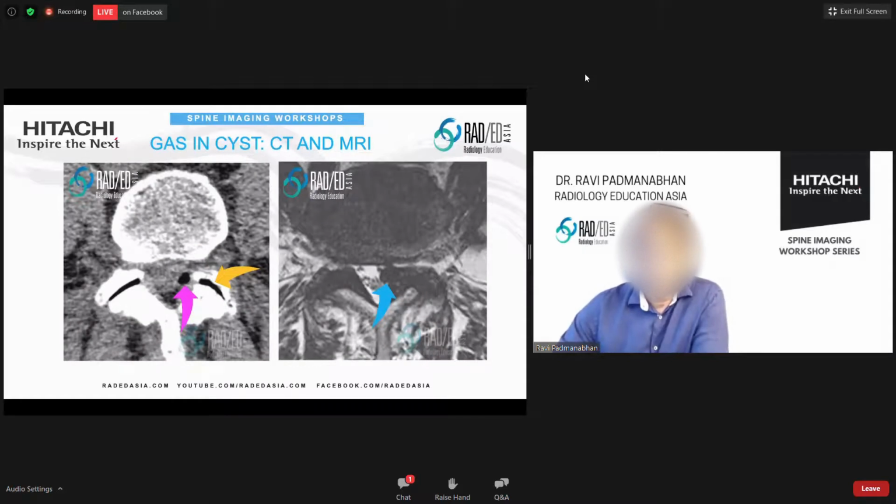What about on MR? So on MR, seeing gas is difficult because air does not have signal. These are both scans from the same patient. We've got gas within the canal, but here it's impossible to know what this is. This could be calcification, it could be ligamentum flavum, it could be gas. You don't know. So luckily we had a CT as well, so we could work out that that was actually air. But it can be very difficult on MR to diagnose the presence of air when it's small like this.